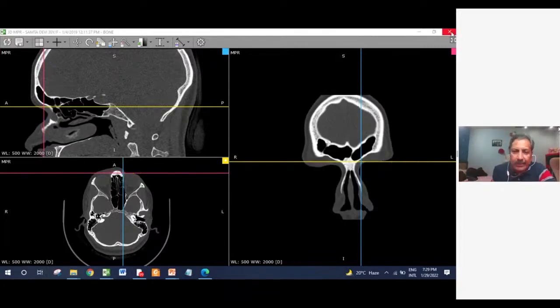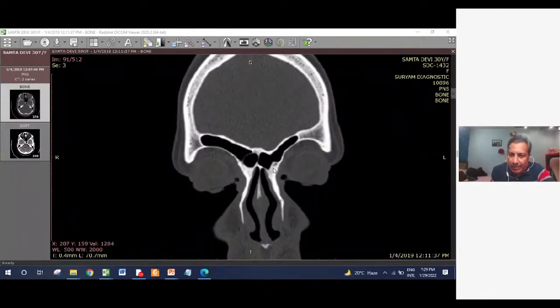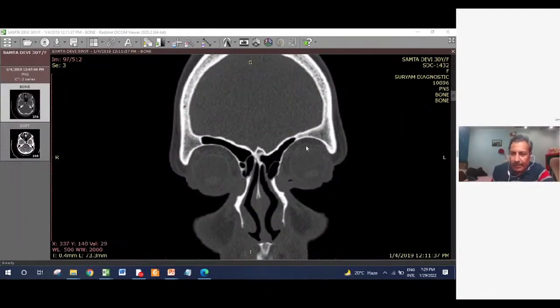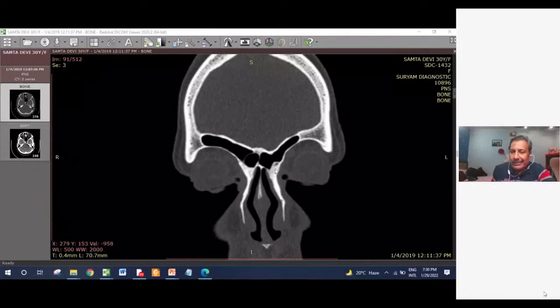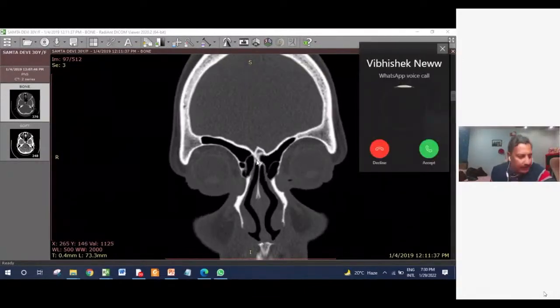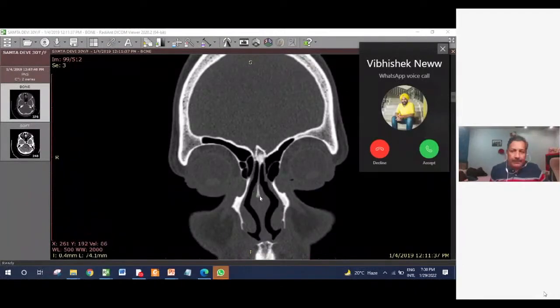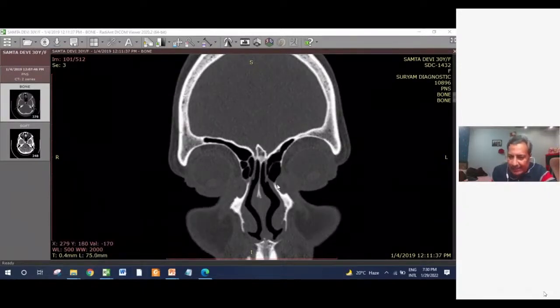Here we are talking about chronic sinusitis. So here, after the frontal sinus, as you go behind, the orbit has started coming into the picture. Now, in the frontal recess, see, when your beak goes, the cellularity starts coming into the frontal recess. See the first cellularity which you are getting in the frontal recess, these big cells.